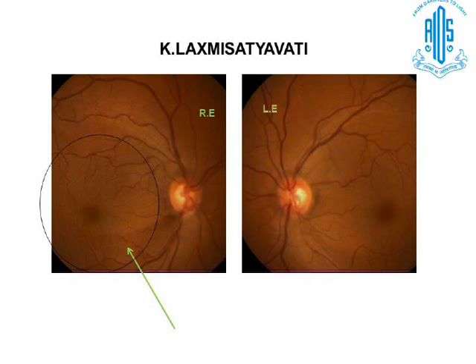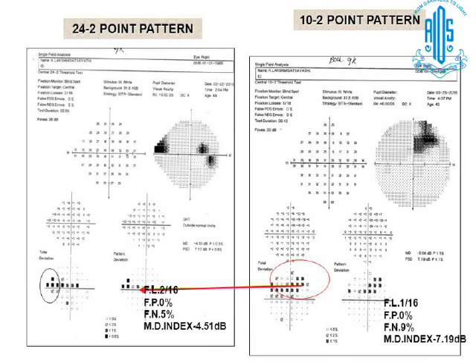The disc of that patient and this patient looks almost similar. In that patient we had not seen a nerve fiber defect, but here we can see the nerve fiber defect. And the disc is almost symmetrical to what we saw in the suspected case. And in this case, we see a broad nerve fiber defect, and you see the disc.